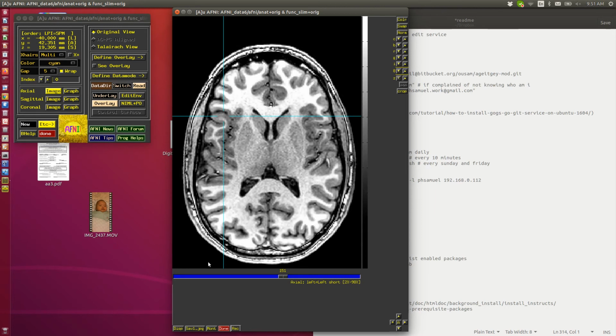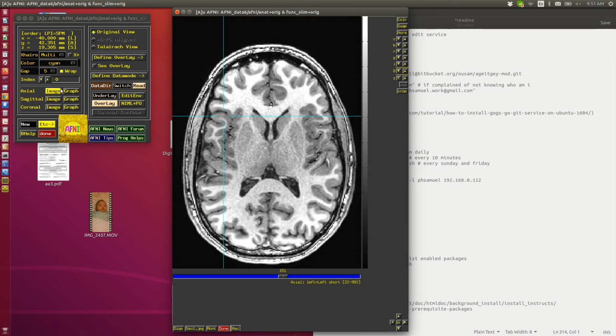So that was relatively easy to do, and I did it to please him because I like him. And he's a nice guy. And it's a lot easier than these C and B buttons, which were there for like 15 years or something before someone suggested a different way to do it.